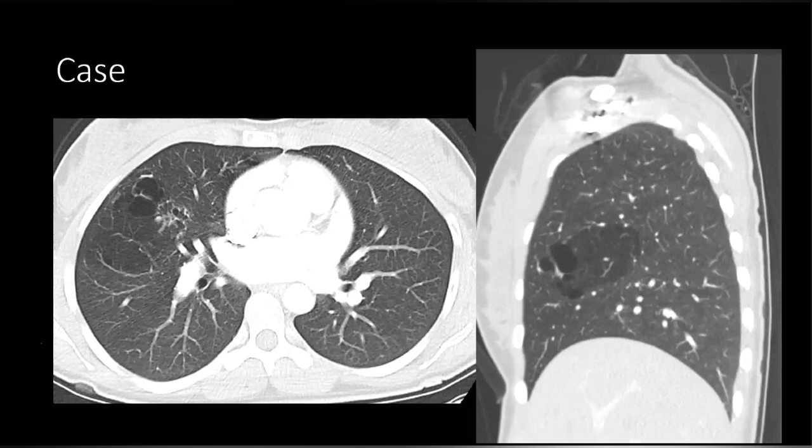Okay. Congenital lobar overinflation. That's in the upper lobes, sir, it appears to be an adult chest. So congenital lobar inflation. Okay, I'm putting it in a very low differential. So what do you think it is? Is it a sequestration? How would you differentiate it?